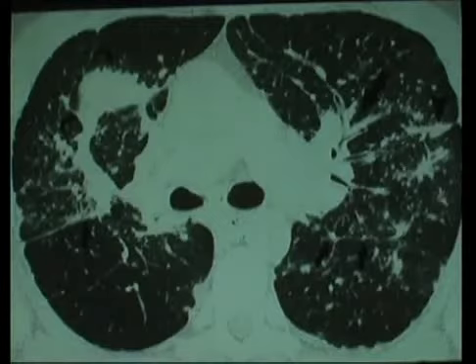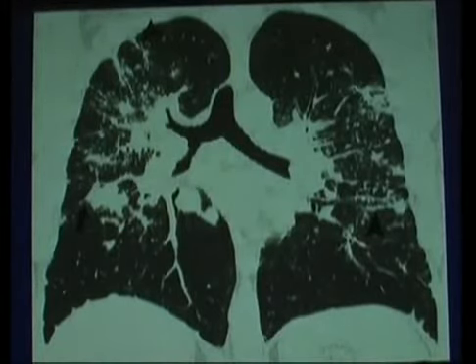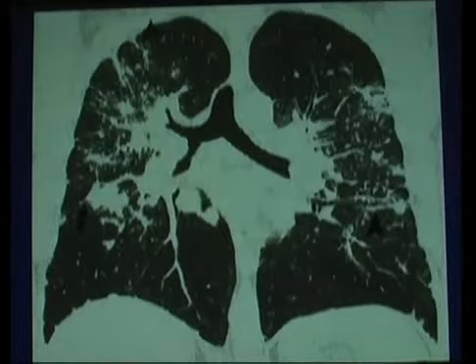Again, more clustered disease, more massive, but again, look at these airways, huge nodes along the fissures, nodules along the pleural surface, really kind of clusters of ill-defined nodules, some of them conglomerate. This is not cancer. The one thing you have to be a little wary about in sarcoid is these patients can get TB, so if you start to see cavitation, you do have to be aware you can have sarcoid and TB together, especially if you work at Bellevue Hospital. Upper lobe distribution, the lung base is spared. Again, you should have no problem differentiating this from IPF.